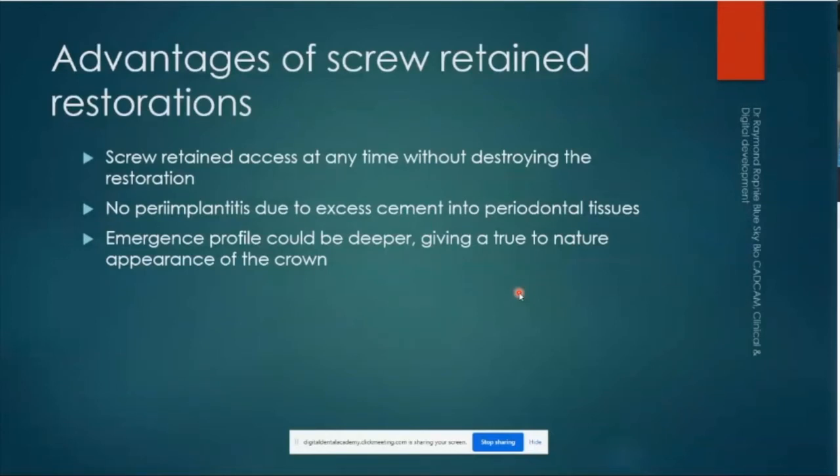As well, the most important part for me is creating an emergence profile. Given the importance that the emergence profile is required in implant dentistry, I cannot stress enough how important an emergence profile will be in order to create an aesthetic restoration at the end of the day.